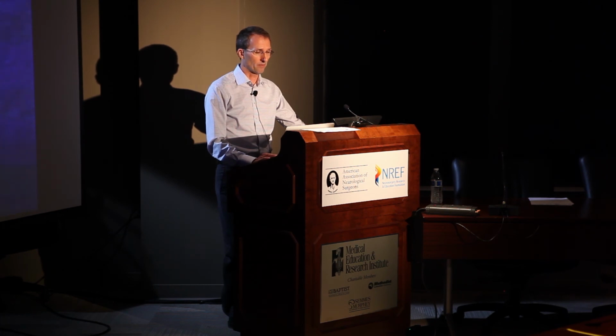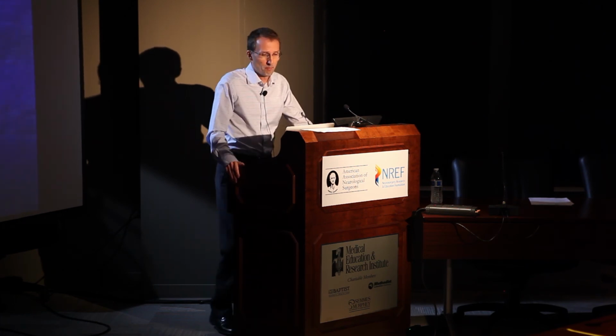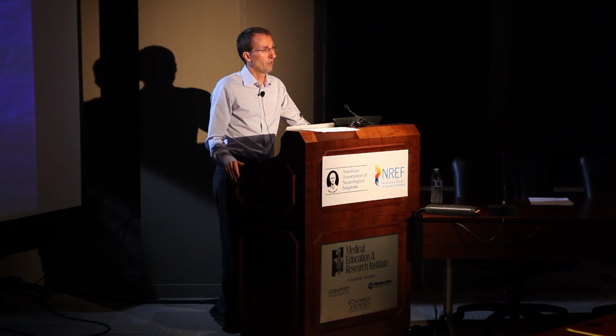And I'm going to talk about from a transarterial standpoint, the best thing to do is to use a liquid embolic agent. And this is where I think, even though Onyx is not officially approved for fistula treatment, it's for cerebral AVMs, it really has sort of revolutionized transarterial approach to dural fistulas. But with something as powerful as Onyx comes issues, right? And so I like to think that danger lurks in tiny branches.